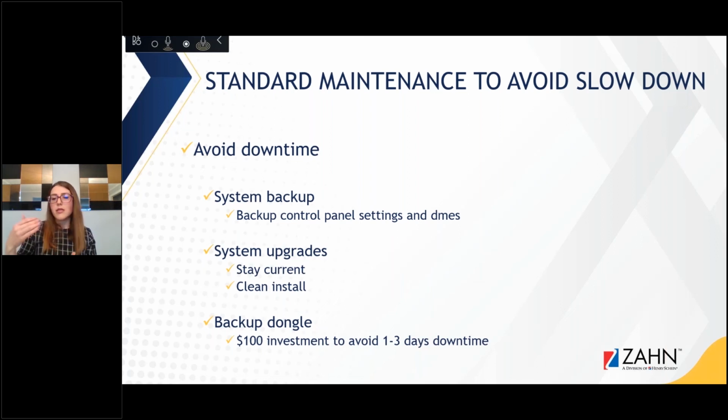And it's easier even when you set up the order form. So getting to what you need down the implant library list when you have only the 2, 3, or 5 implant libraries that you're using is easier than scrolling through dozens of material libraries or implant libraries. Those can easily be deleted as well out of your control panel, and I can show you that in a minute. So if you imported an implant library last year because you needed to use it for one case, you can always just delete it again.